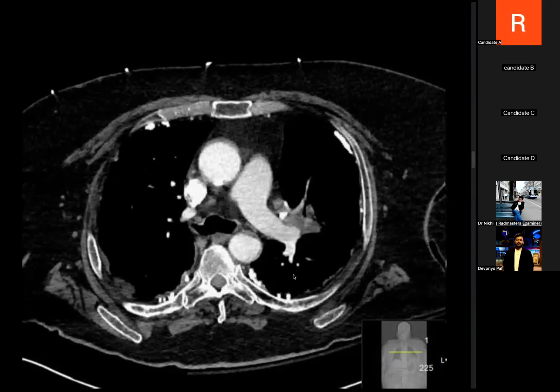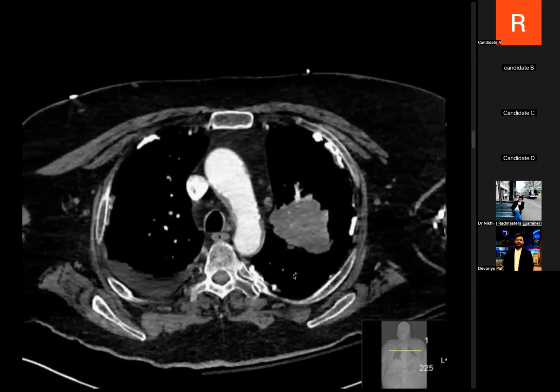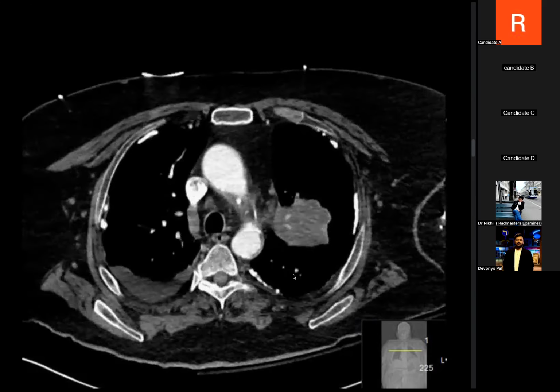If I were in your place, I would have said that I see diffuse pleural calcifications. In my routine practice, if this patient had a prior history of trauma, I would look for rib fractures, and this could possibly hint towards a hemothorax resolved into a calcified pleural plaque, right? And if this was a patient who had traveled to an endemic nation, I would think along the lines of tuberculosis. You see what I'm doing here, right? I'm trying to tell the examiner that I know these are the possibilities, and I also know what the clinical histories are that I should be looking for in the case, correct?